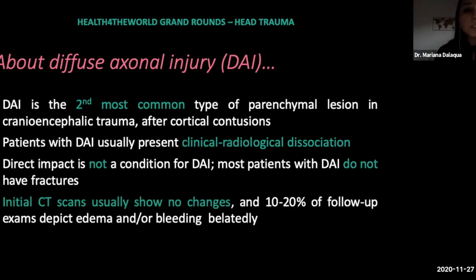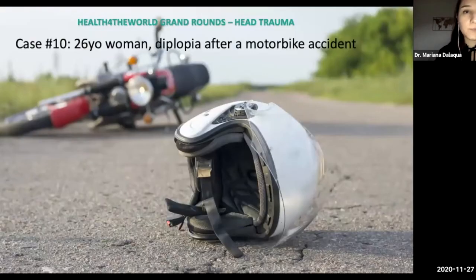Okay, so initial CT scans usually show no changes, and 10 to 20% of follow-up exams will show edema and or bleeding, only a bit later. Okay. So case number 10, a 26-year-old woman with diplopia after a motorbike accident.